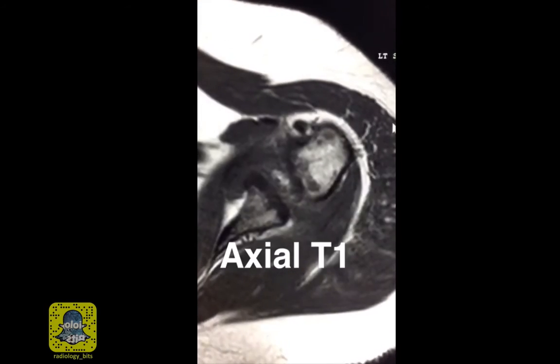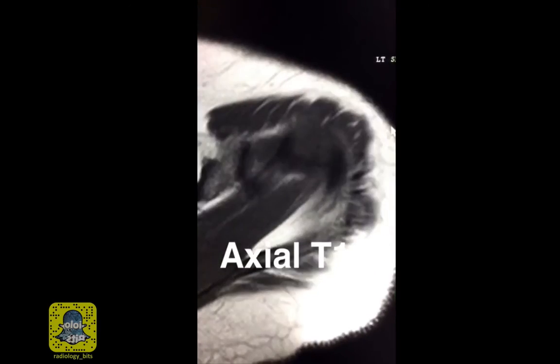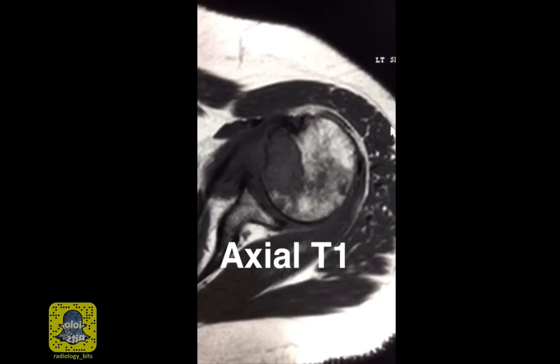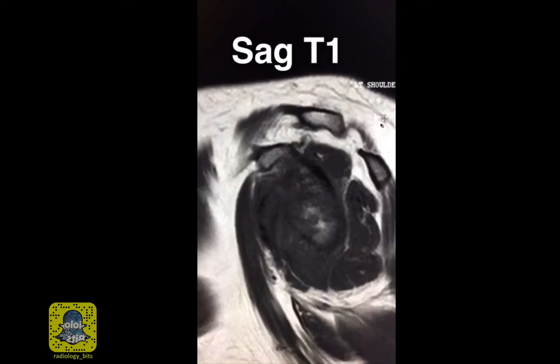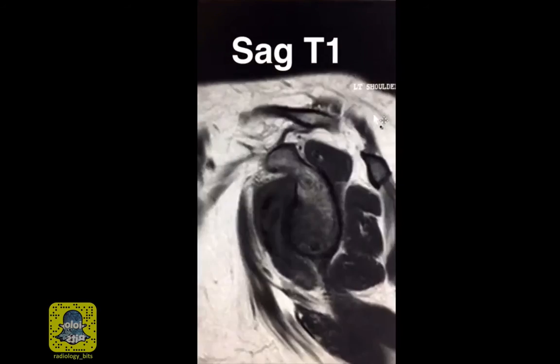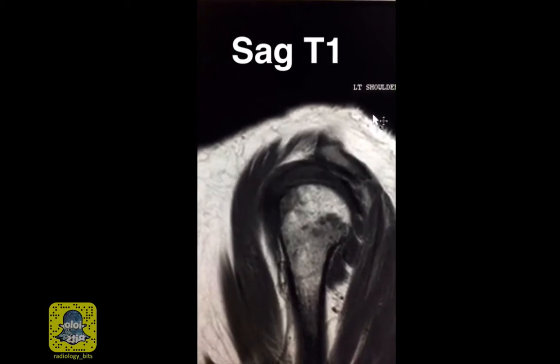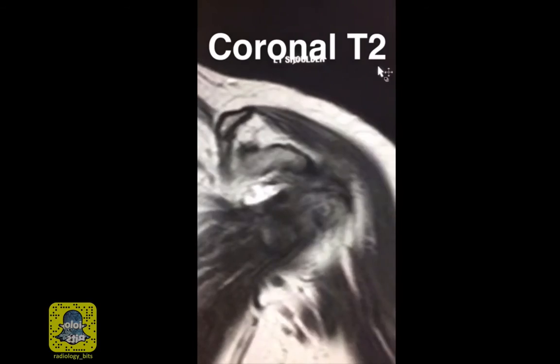This is the left shoulder MRI. This is an axial T1. Here's the sagittal T1. I'm going back and forth. This is a coronal T2.